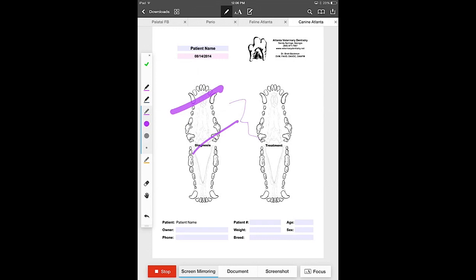And these last 2 pens are for small font up to 3. The top 2 pens can go up to 18 font. If you want to erase those, you can tap the eraser here and erase part or all of those. If you would like to, just tap on the bottom arrow, and it will erase the things that you've done, either erasing them or producing them. You keep tapping that in order to eliminate those.